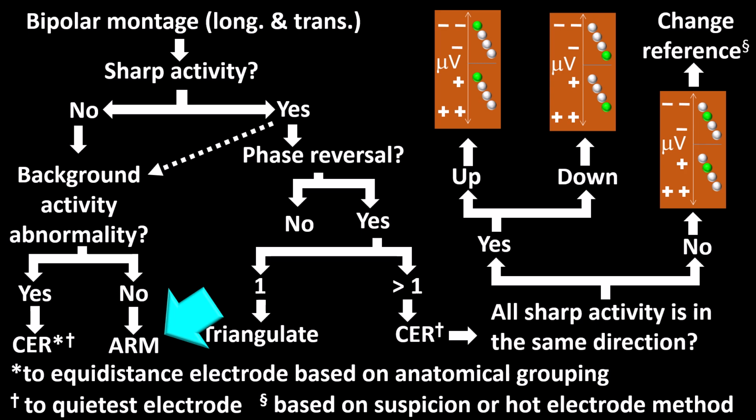If it is appropriate for age and I do not see background abnormalities or any sharp activity, I register that epoch as normal. I do this process for a few epochs, looking at the same parameters. I conclude that everything looks well. I go ahead and tentatively formulate a conclusion. That conclusion is that the EEG is normal.